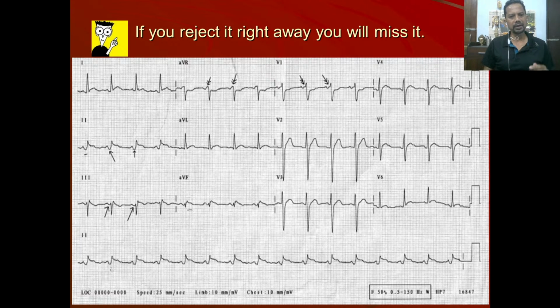You look at the P waves, look for atrial MI like in the previous ECG. In aVR there is ST elevation of the distal limb of the P wave. This is also called the PT segment. In inferior leads there is depression of the descending limb of the P wave, the PT segment. So out here you see this depression, this is not a Q, this is depression of the P wave. This is the isoelectric line. So the P is extending, depressing more beyond the isoelectric line. This is atrial MI. The distal limb is going down, sagging in inferior leads.